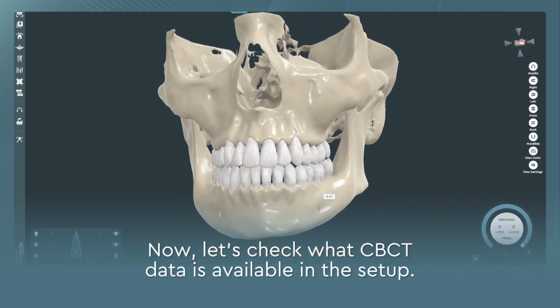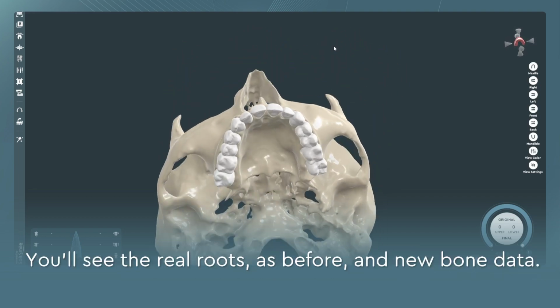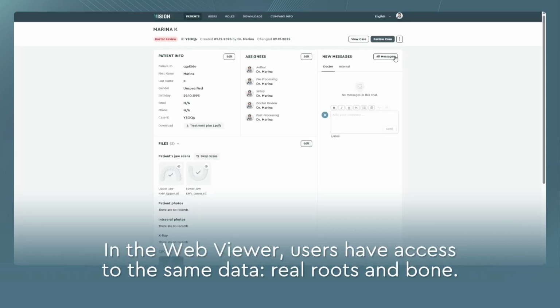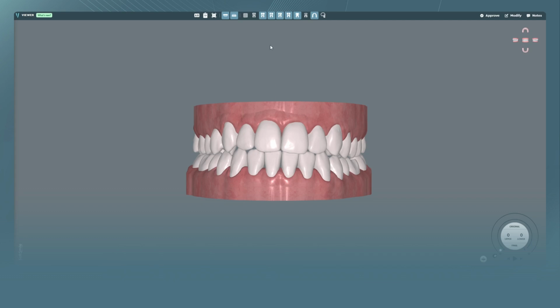Now, let's check what CBCT data is available in the setup. You'll see the real roots, as before, and new bone data. In the web viewer, users have access to the same data, real roots and bone.